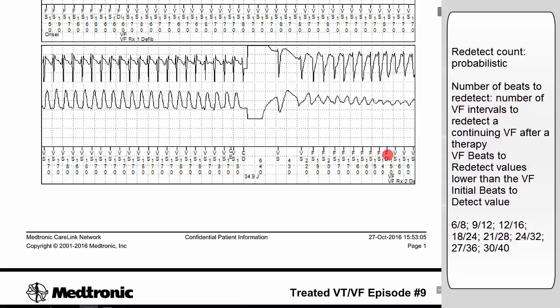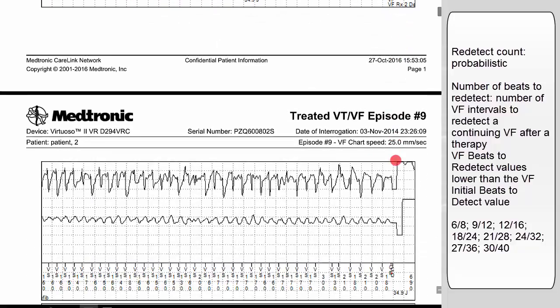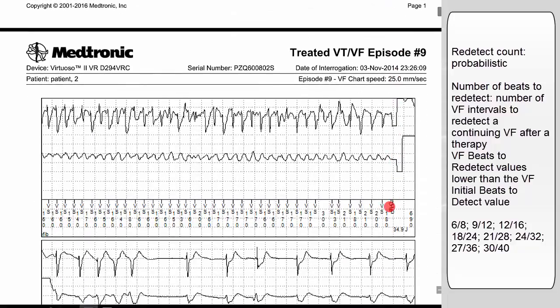What is important to know is that once you have redetected an arrhythmia, whatever happens then, the shock will be delivered since it is committed. So at the end of the charge here, there are 2 options. Either there is sensing of a ventricular signal like here, and then you will synchronize the shock on this ventricular signal, or for example, if there is undersensing and nothing is sensed in this time of 900 milliseconds, no signals, then you will deliver the shock asynchronously.